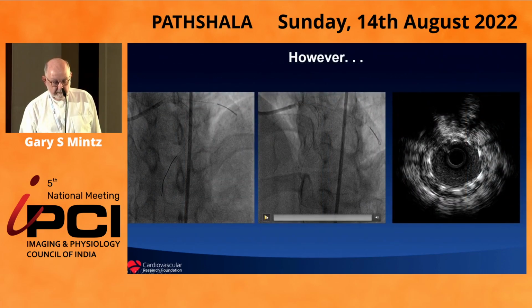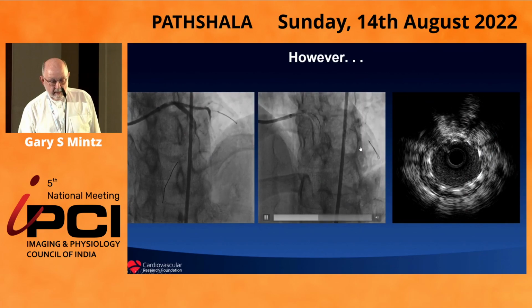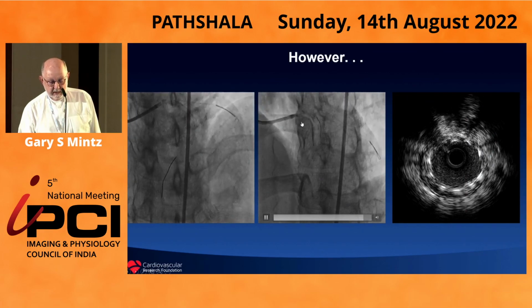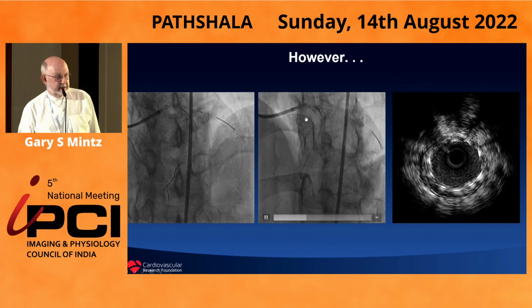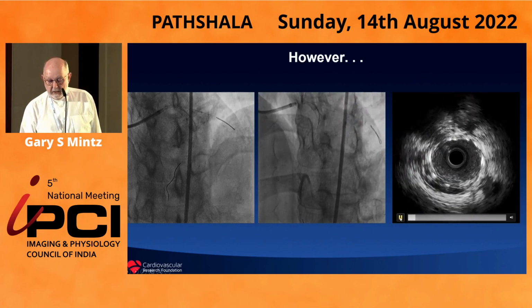However, if you look carefully, the left main no longer looks as pristine as it used to be. Little haziness in left main. So IVUS imaging was done.